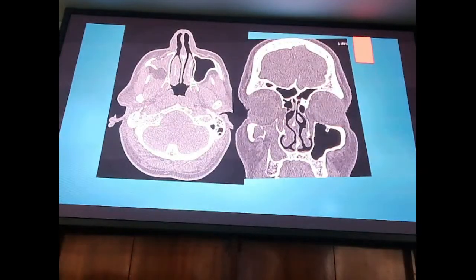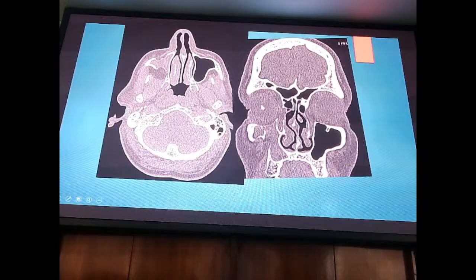And you want to see what the CT scan looks like? You can see there is actually hypoglobus on this side. It is not that there was excessive scleral show on the left side. The pathology was on the right side. Of course, I had the advantage. I didn't tell you which side maxilla he had pain, but it was on the patient's right side. So the eye had gone down. There was a hypoglobus actually, and the reason for this is an imploding antrum or a silent sinus syndrome.